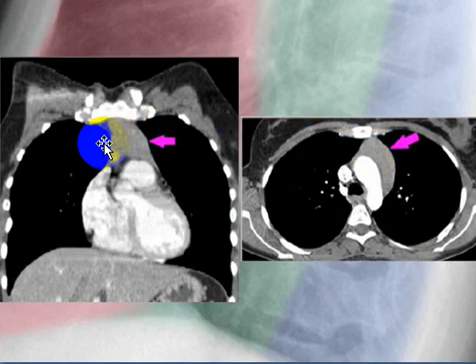Here we see the anterior junctional line separated by a densely enhancing mass due to thymic hyperplasia. In this patient, there is widening or loss of the anterior junctional line due to a thymic mass and hyperplasia of the thymus gland.